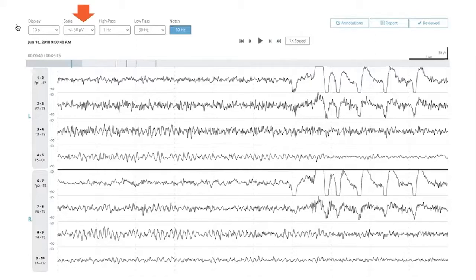But when you are dealing with iPhone size screen versus a plasma TV size screen, then calibration of waveforms in microvolt per millimeter of that screen will be very problematic. So at Ceribell, this problem has been solved by basically giving an amplitude metric between the two horizontal lines. This is perhaps the only thing that's different on the portal from conventional EEG reading.